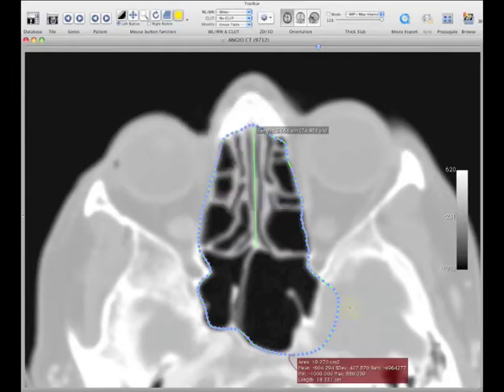And the way the repulsor works, if you click close to it, you get a very small yellow circle. If you click farther away from it, you get a very big one. And I'm going to use that to nudge this back into place. Okay? And then I'm going to click closer to nudge it even to be more precise with it. That's close enough. And this area that I've circumscribed is 17.591 centimeters squared.